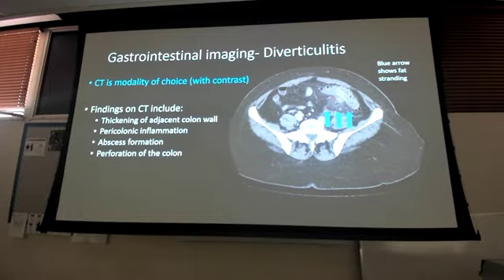I have that fat stranding, that inflammation sitting in that area. That's what we're looking for. And look at how thick the bowel looks. Right? I barely have any opening there. I barely have any pathway on my CT. It's just all tissue. Because it's just fat, it's angry, it's thickened. Okay? All right.